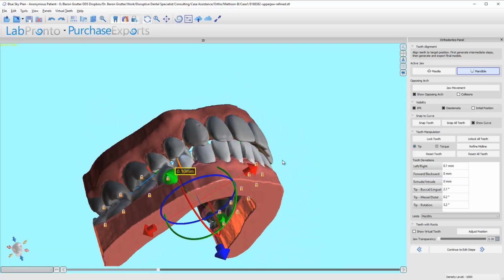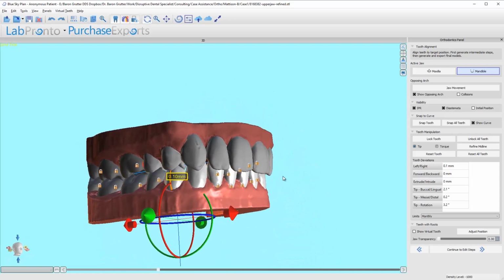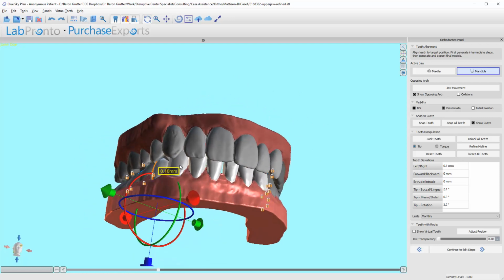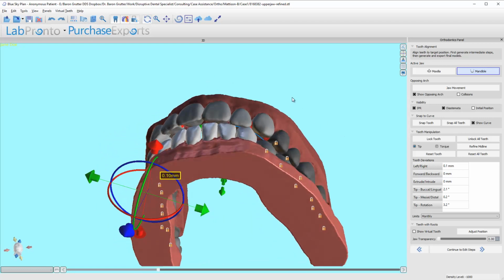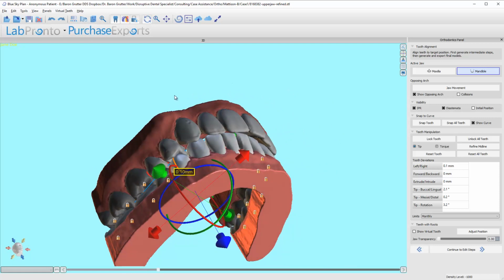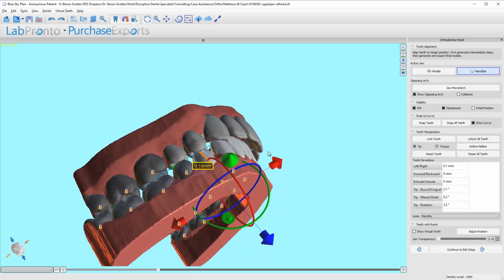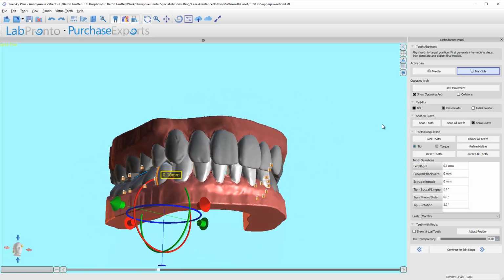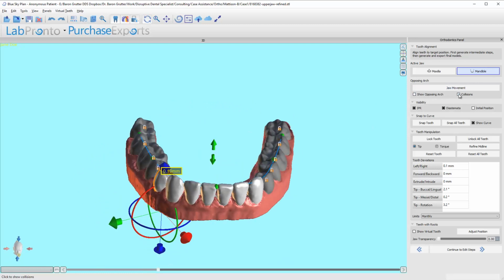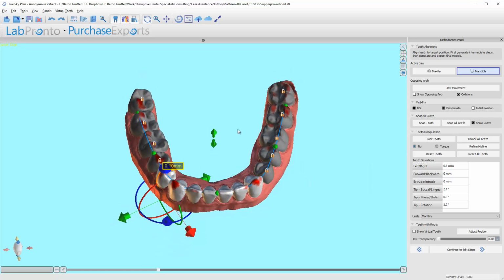So what am I seeing here? Now we extruded these teeth, so that's obviously going to cause some impact, and it's going to impact the other side. And I can see that right here on this canine, this premolar, possibly that premolar. I would assume so, at least. I can also turn on the collisions, and it will calculate how things collide, and you can see those high points.